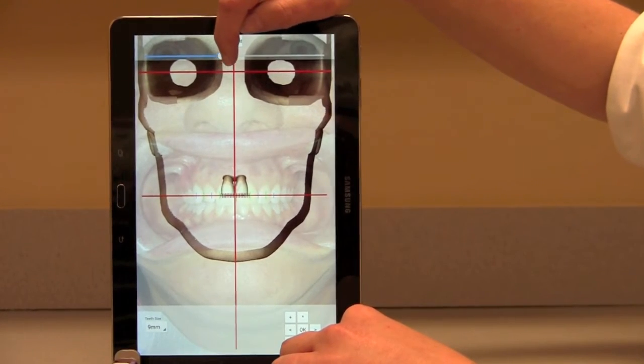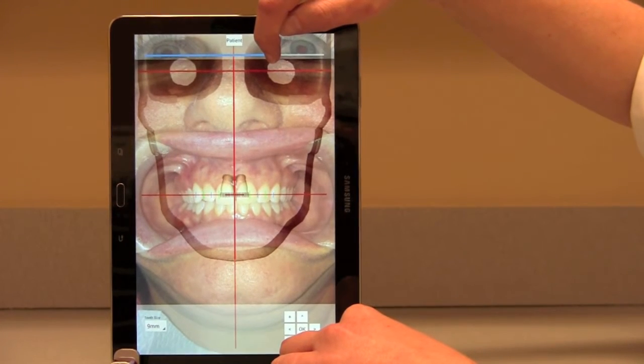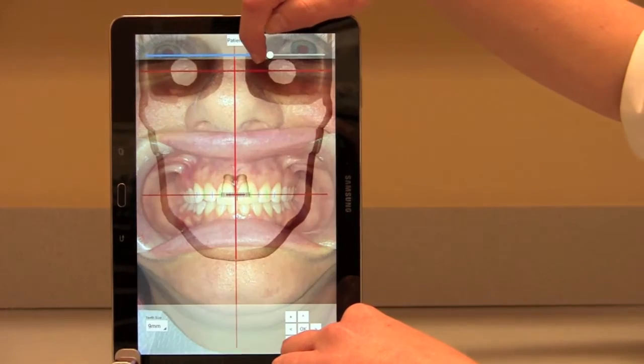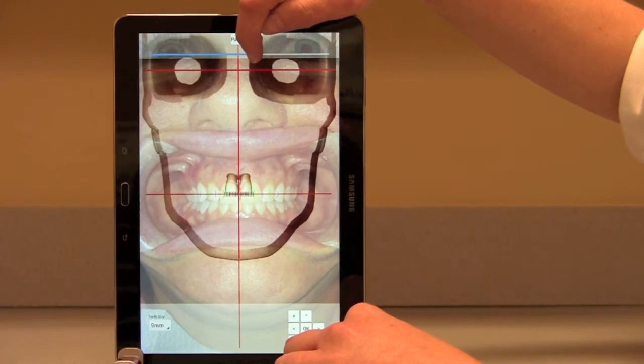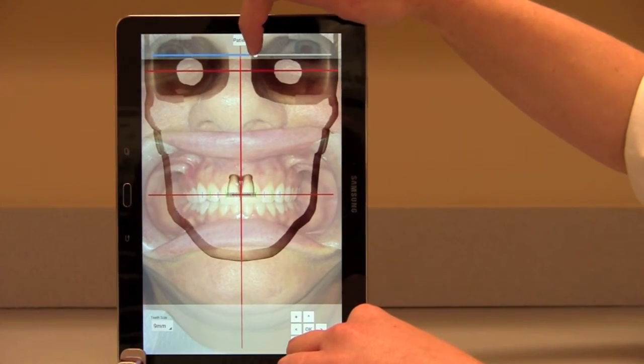Right now we want to go ahead and bring in Vanessa's photo so we can compare. You can bring in lots of photo or less. We normally recommend about half and half so you can see both. I'll do just a tiny bit more.